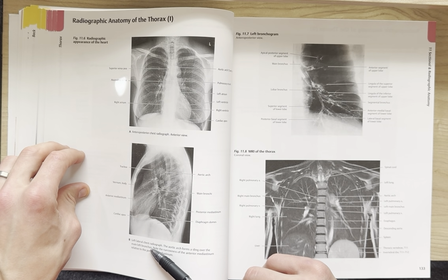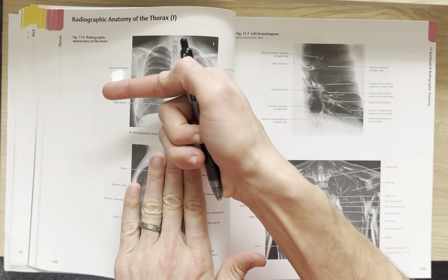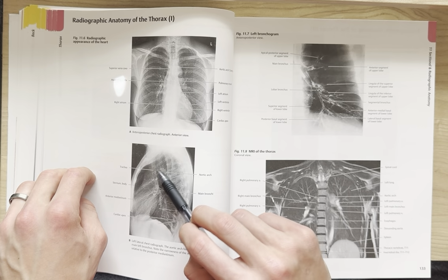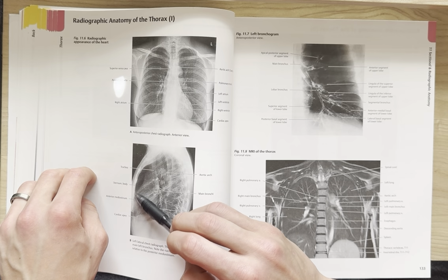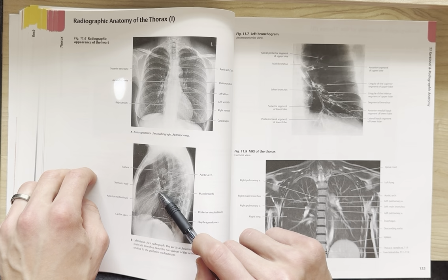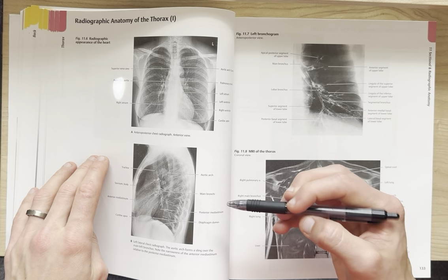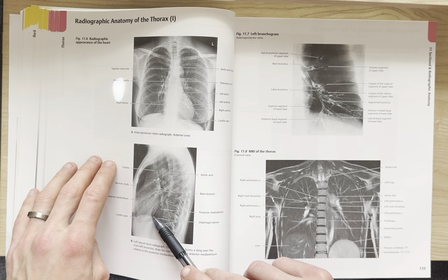Here's a left lateral chest radiograph. So the patient is turned to the side, they're facing this way, and the radiation is going through the patient. So here's the trachea, the aortic arch, seen very faintly right here. Here's the sternum for orientation purposes, and that leads to the anterior mediastinum. There's that cardiac apex again. Interestingly, we can see the main bronchi, and you can almost see the carina right here, that little V structure where they fork, the bifurcation that takes place. Here's the posterior mediastinum and the diaphragmatic domes.